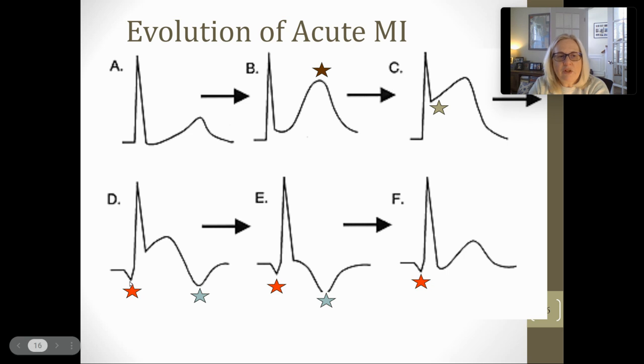But you take a look at this red one. This is going to be a new one for you. Notice up here, the Q wave just kind of goes in very quickly, and usually the Q wave goes down, or it might stay level with the isoelectric, but it stays really small and narrow, not deep and really narrow. But after you've had a heart attack, it leaves a permanent scar in that region of the heart, okay? It leaves this. It's called a pathological Q.